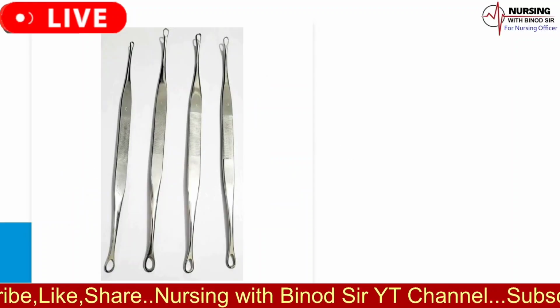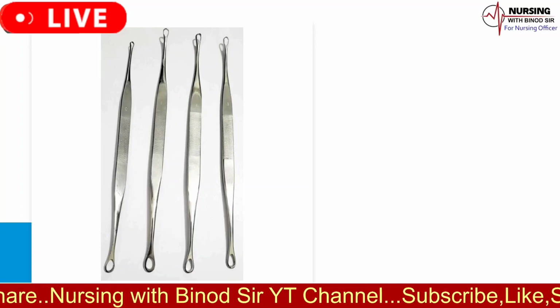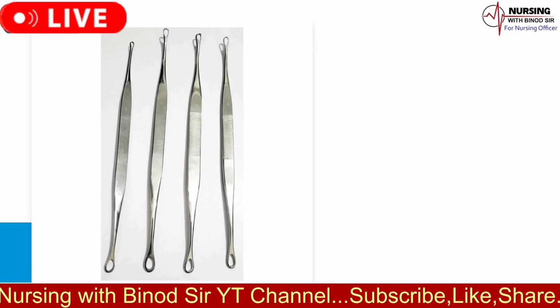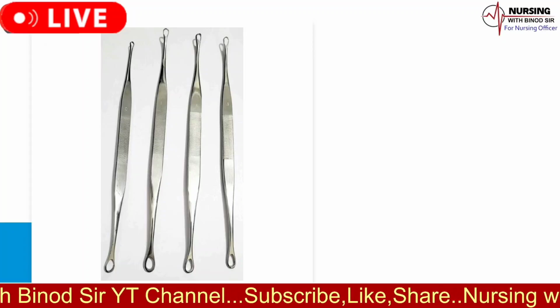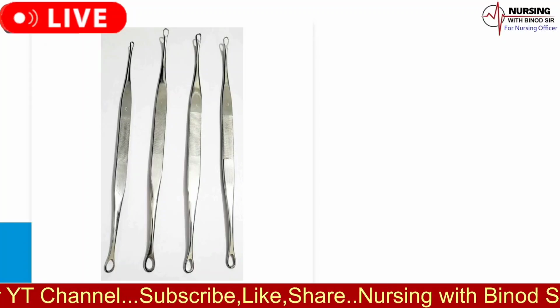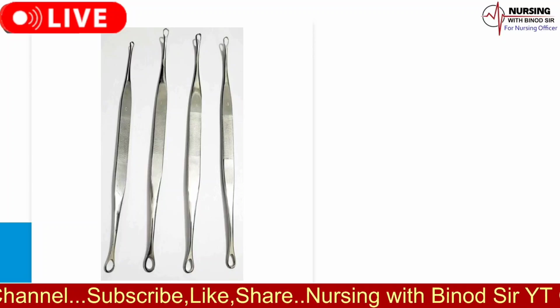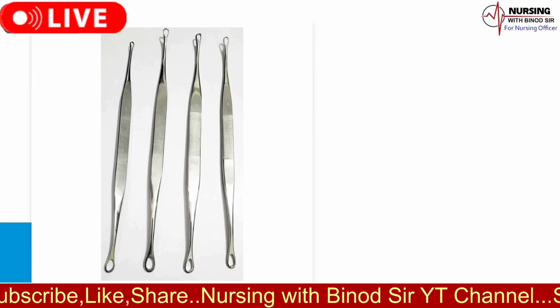The name of the instrument is uterine curette. The uses of uterine curette are as follows. 1. Dilation and curettage, D&C. The curette is used to remove tissue from the uterine lining for diagnostic or therapeutic purposes, such as after a miscarriage or for removing excessive uterine bleeding tissue.